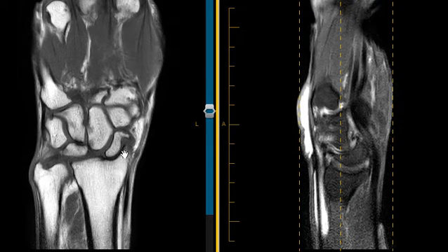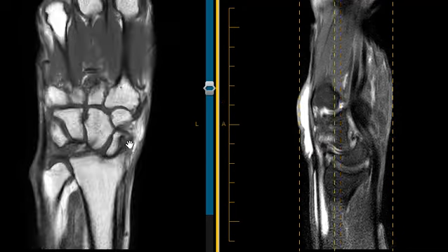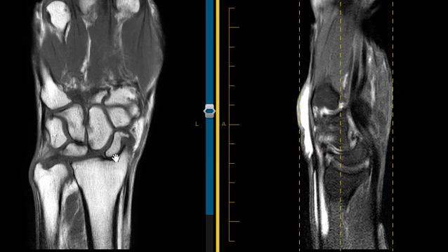So this is what we call a SLAC, S-L-A-C wrist. It's a scapholunate advanced collapse is the term they give it. And that basically means that the scapholunate ligament is torn, capitate bone is migrated down, there's abnormal mechanics of stress, and you get these bone erosions and arthritic changes related to the abnormal pressures related to this ligament not functioning.